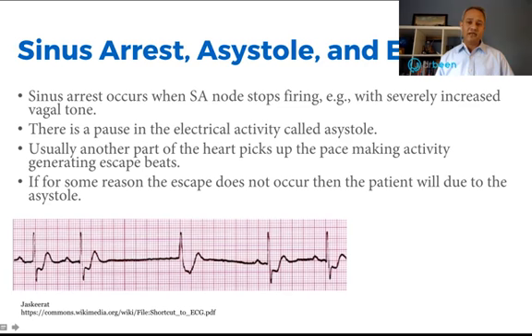We don't know if it is the AV node. We don't know if it is the conduction pathways, or if it is the ventricular system. We can have a guess by looking at the rhythm. So look at the rhythm here: 1, 2, 3, 4, 5. So about 5. 300 divided by 5 is about 60-ish. To me, this looks like a junctional rhythm. This looks like the AV node doing the function, because the AV node can produce up to 60 beats per minute.